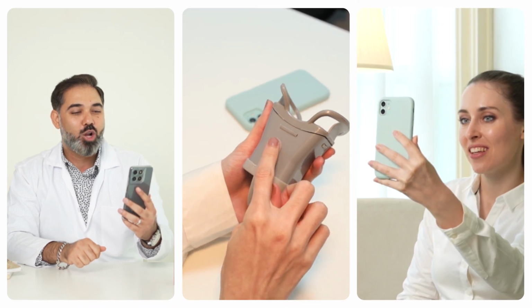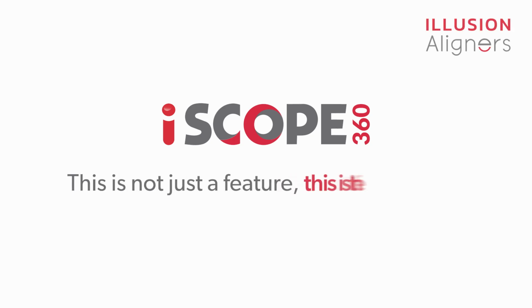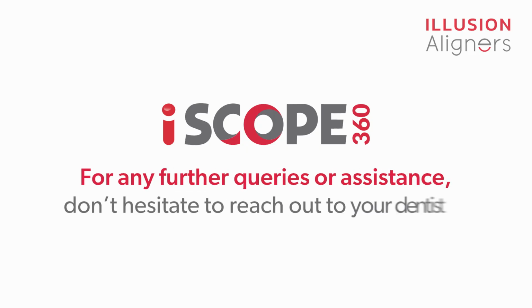That's it, guys. That's iTrack Live. This is not just a feature. This is the future of your dental journey. For any further queries or assistance, don't hesitate to reach out to your dentist.